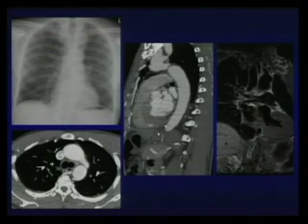You can see the narrowing of the aorta. You can see the sagittal reformatted imaging with the narrowing of the descending aorta, and you can see here in the MRI that there is a typical appearance of the figure 3 sign. The notching is seen here in these 2 ribs, and you can see like a minimal scalloping in the inferior aspect of the ribs.